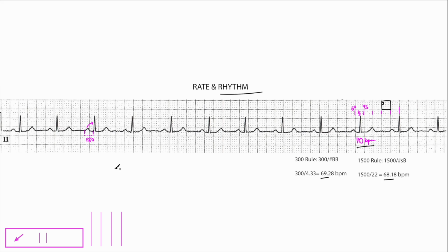You do have to keep in mind how old your patient is. So if you don't know how old this patient is, do not ignore first-degree heart block. A lot of times it just gets pushed aside. But if your patient is under the age of 50, first-degree heart block is significant.